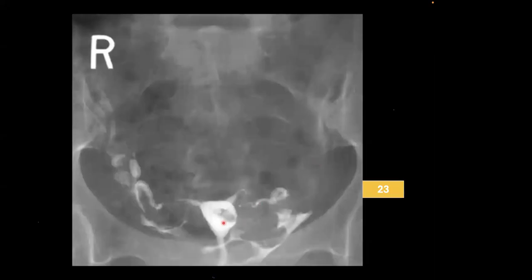Okay, so in this case, many of you have called it endometrial polyp, but this is not a very well-defined thing. It is more so because some air locule must have come. Because of that, there is a filling defect. But you can see the fallopian tubes are being pulled apart. They are going laterally towards the pelvic wall. So there are certain adhesions which are forming with the fallopian tube.